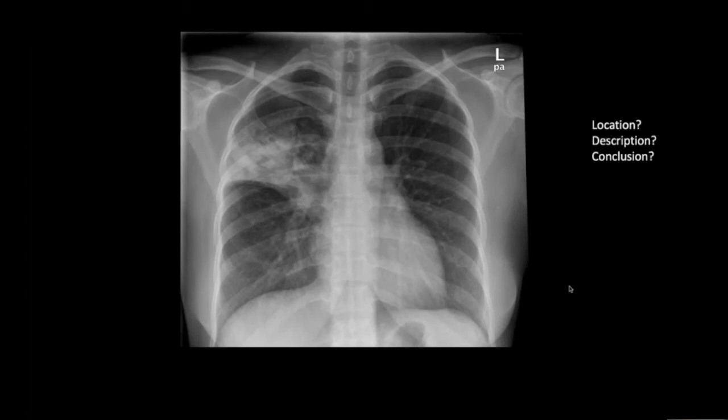On this chest radiograph, you can see opacity in the right upper zone. The upper border of the lesion is ill-defined. It is bounded by the transverse fissure inferiorly, so this lesion is located in the right upper lobe. There are interlinear lucencies in keeping with a bronchogram. So this is right upper lobe consolidation.